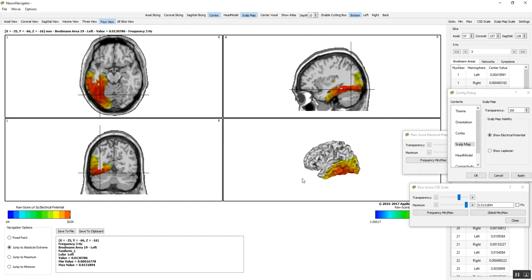And now let's navigate through this rendered MRI. This is the inverse solution from the EEG scalp electrodes using the boundary element method, which gives you fairly high accuracy, and it's sLORETA, which means you can go down through the cortex and look at depth as well. But initially, let's slice through this brain.